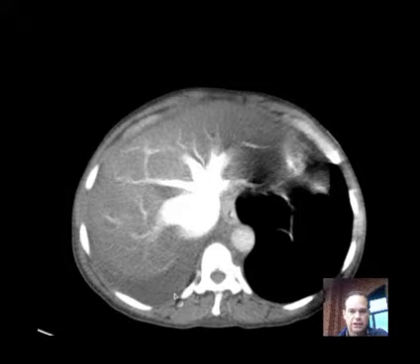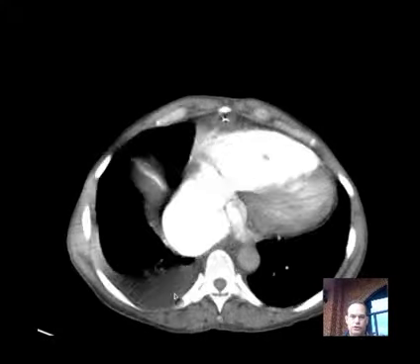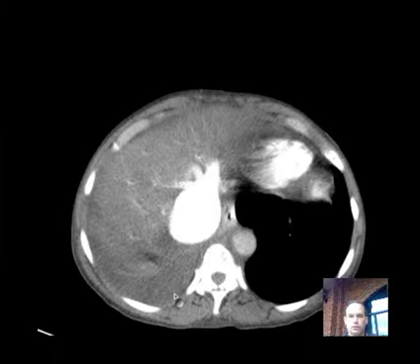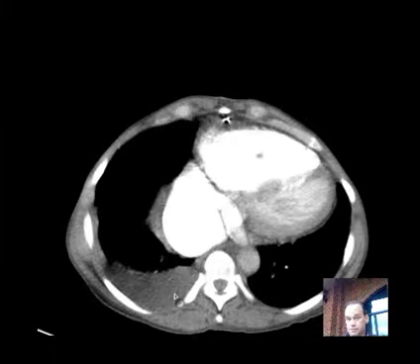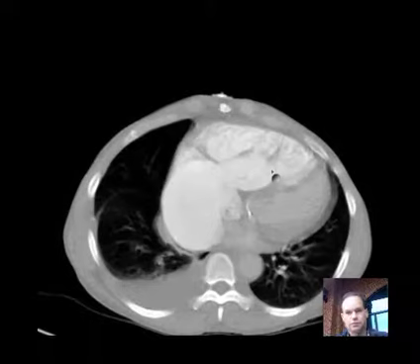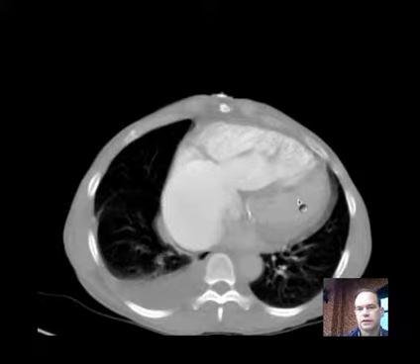Okay, so look at the anatomy here. I'll draw your attention right away to the vascular system. And looking here at the heart, what do you see that surprises you? Look at the discrepancy here between the right ventricle and the left ventricle.